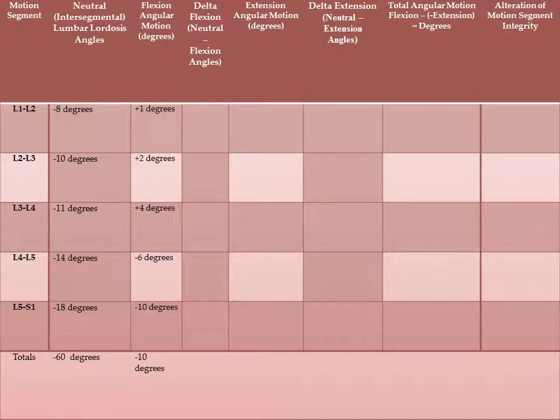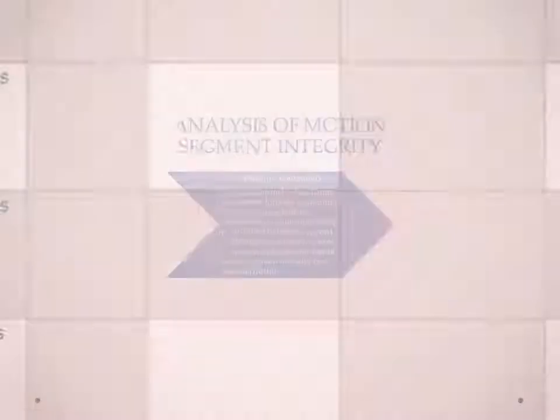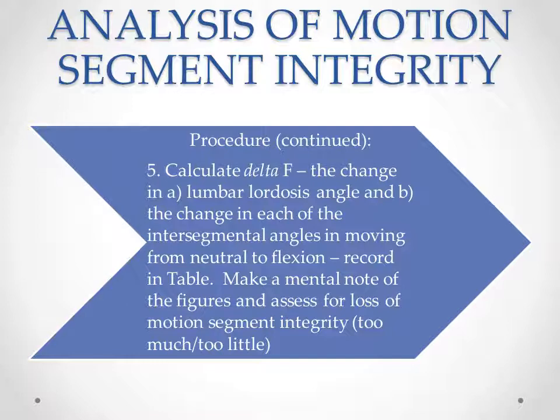Record those in your table. And you can see here that I've recorded those on the table in column 2. Next step.